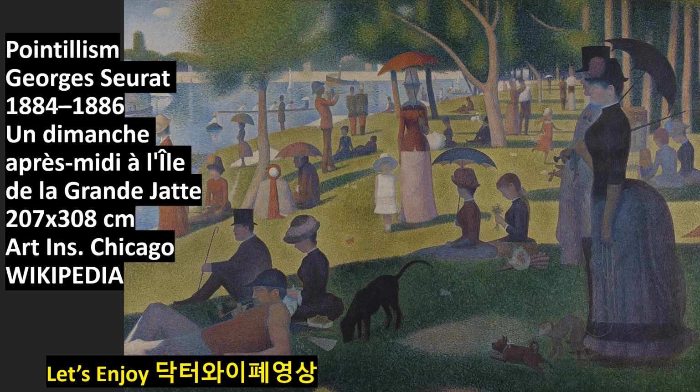Actually, it is displayed in the Art Institute of Chicago. It is not brush touching. It is just a point. Every point represents a component of color, and those points show this wonderful painting of Sunday afternoon in Paris in 1884. This is pointillism, micronodules.